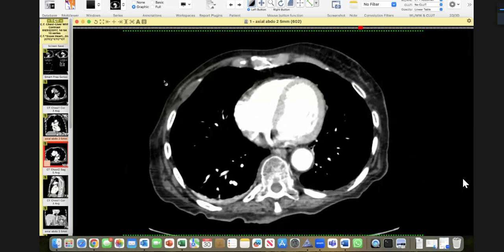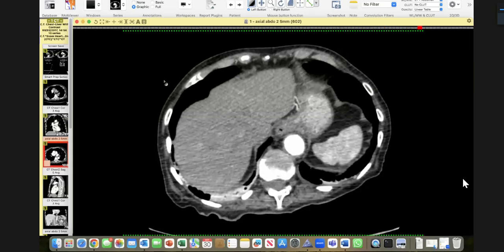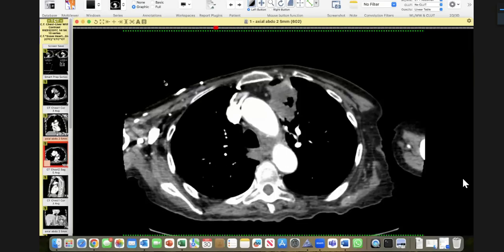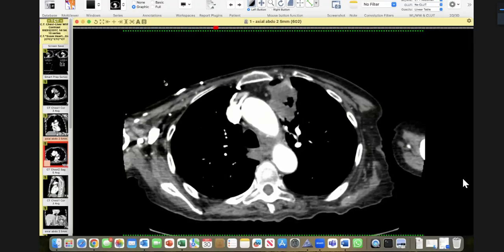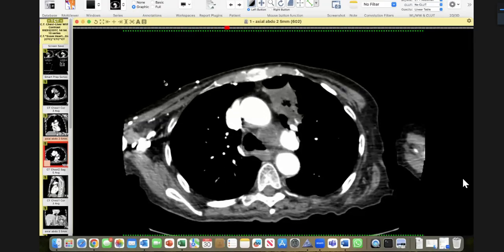There is bilateral relaxation atelectasis. I'm concerned here, other than the lesion, with this opacity here. I want to see the coronal mediastinal window to see if it is continuous with the lesion or if this is just an enlarged mediastinal lymph node. Can I see the coronal post-contrast before examining the bone window and returning to the parenchymal window?